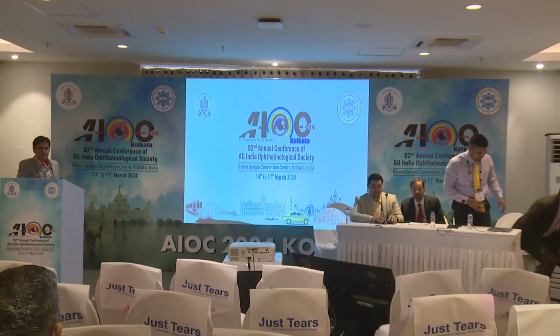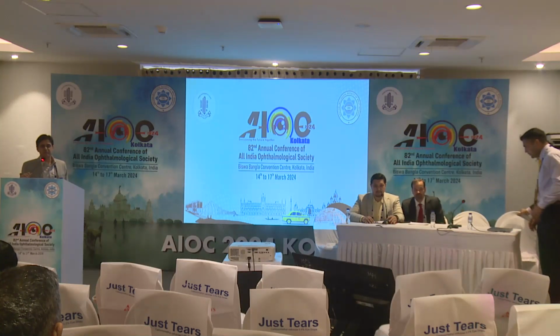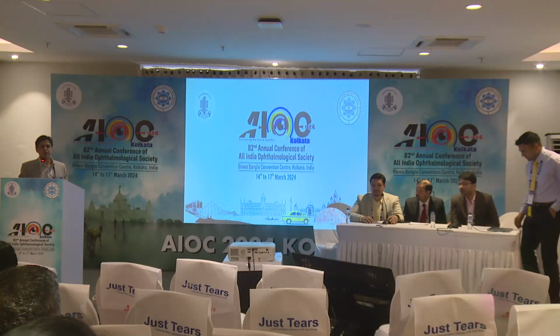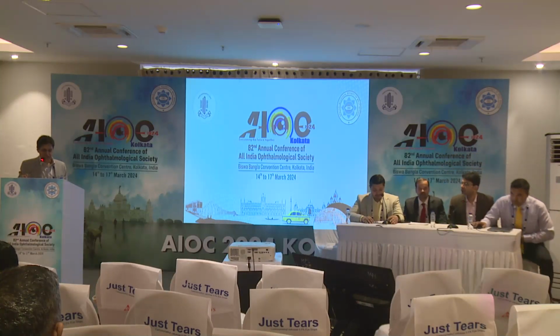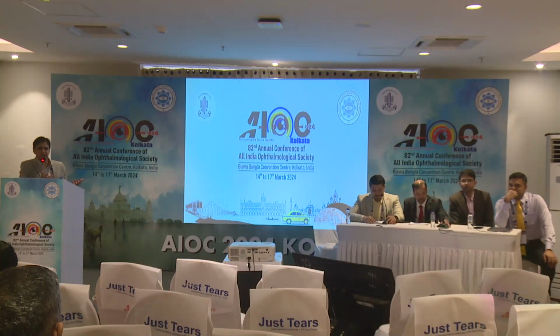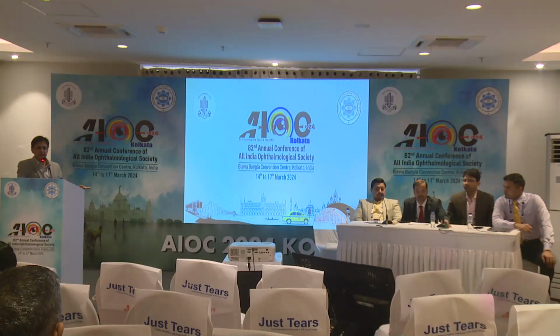So first of all, PDT, sorry, that's what I said. PDT was not available, so that is why we were not doing it. I'm not saying that you do ICG. ICG really helps to make you a diagnosis that this is a PCV. So PCV management is slightly different from AMD. In PCV you have to be slightly more aggressive. You have to even tell it may be associated with more risk of subretinal hemorrhages. So you have to also educate the patient. So that is an important part of first of all detecting PCV.